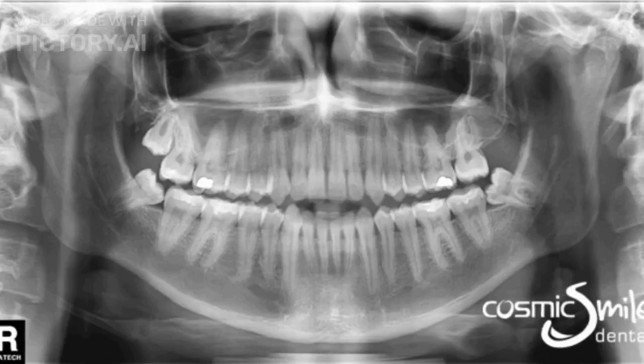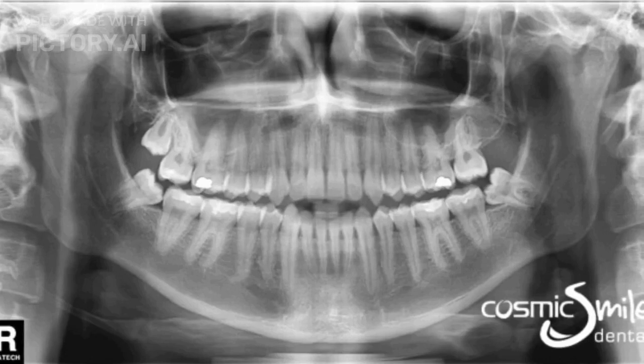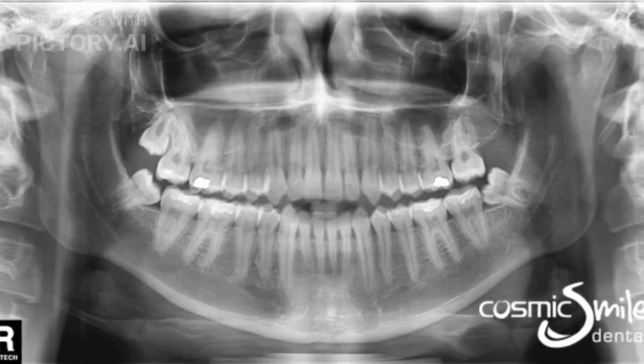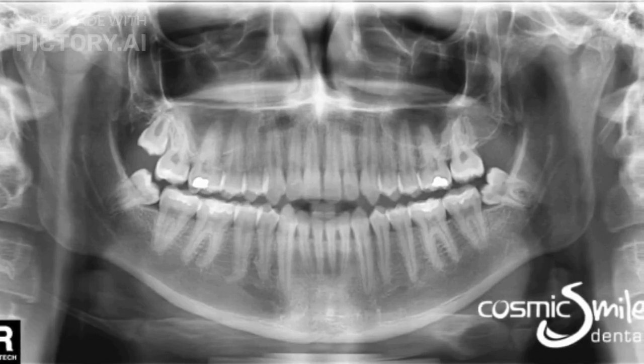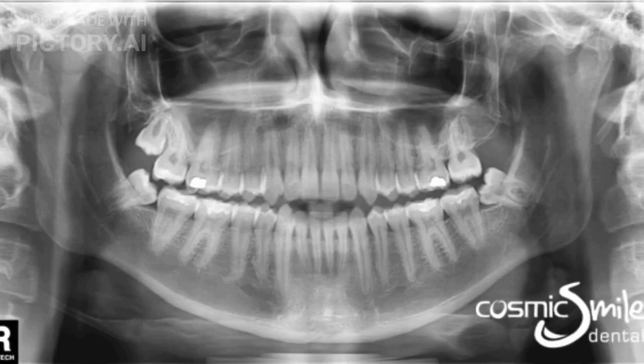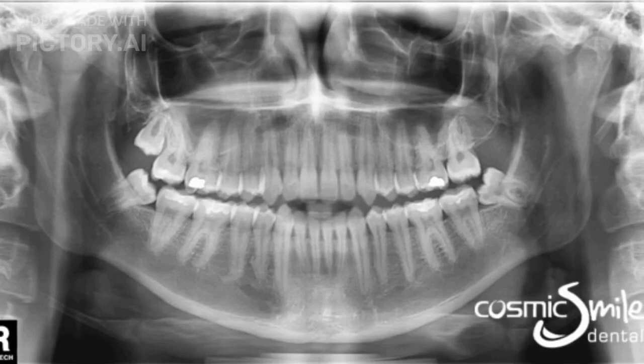And here we reach the most important part for the medical students, that is how to present an OPG to the teachers in an OSCE station or in an exam or viva. So first of all, try to present it. This is a radiographic presentation. First of all, you have to say this is a radiographic presentation, orthopantomogram, or you can write OPG in your viva or mark sheets.